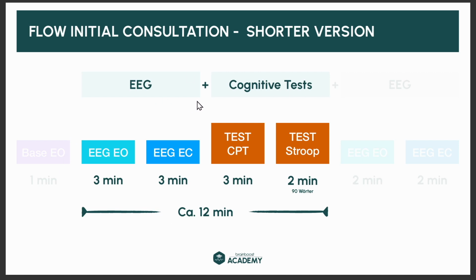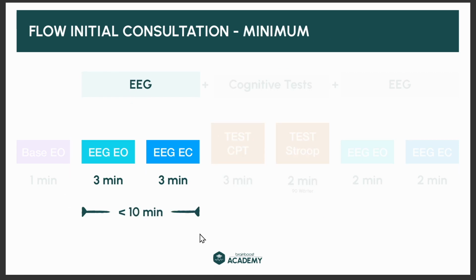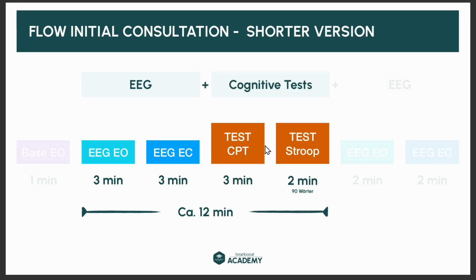It's also possible, and I will show you this later, to create or see these topics in the studio dashboard while just having an EEG recording. But it would be pretty cool if you might insert these tests in your routine. It gives more info. It's also understandable to pitch to clients if they say, I don't know what theta and what, the EEG stuff is. But of course, it should be your expertise that you also address this to your clients.